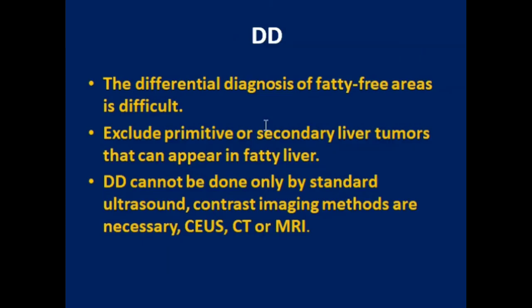The differential diagnosis of fatty-free areas is difficult. So we should exclude primary or secondary liver tumors that can appear in a fatty liver. The differential diagnosis cannot be done by standard ultrasound alone. Contrast imaging methods are necessary, such as CT, MR, and contrast-enhanced ultrasound.